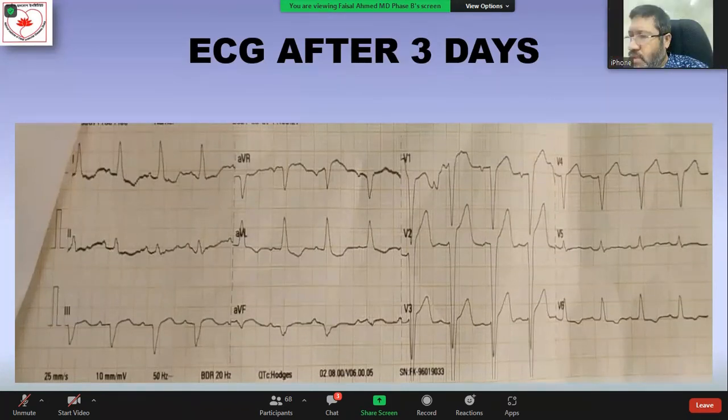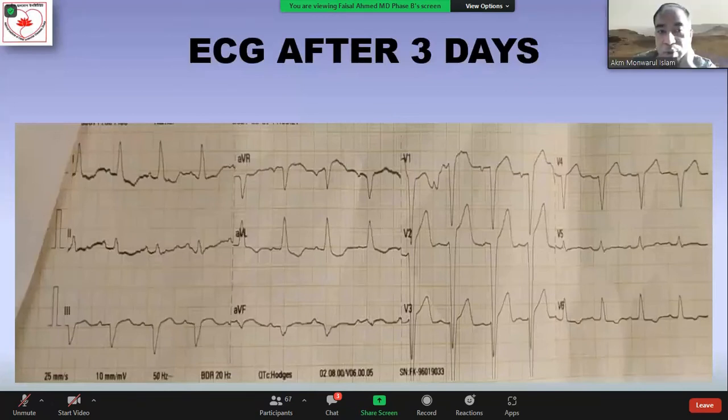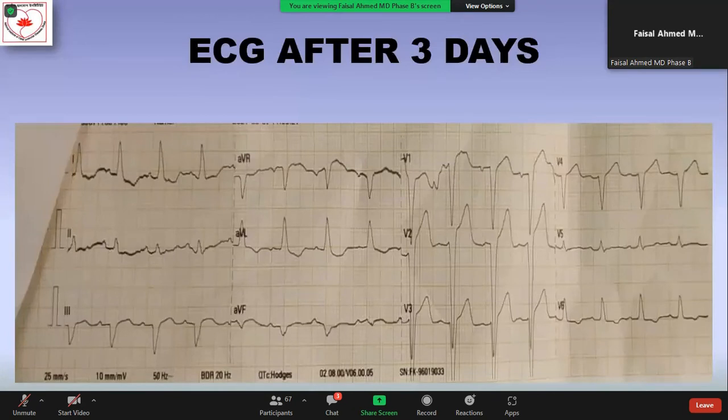এটা ইনকমপ্লিট এলবিবি বলছো কেন? So incomplete LBBB বলছি, the QRS is not wide. এলবিবি বলছো কেন এটা আমাকে বলো। The left bundle branch block বলছি sir, because there is S wave, dominant S wave in V1. নরমালি কি থাকে?